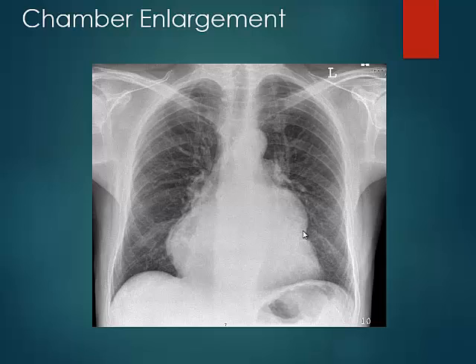Mitral stenosis. From which cause? Rheumatic. Okay, so it's specific to rheumatic valve disease of the mitral valve that we see enlargement of the left atrial appendage. Otherwise, because rheumatic valve disease is less common in the Western world, we don't see left atrial appendage enlargement like this. So this patient had mitral valve stenosis from rheumatic disease, had enlargement of the left atrial appendage, and subsequent pulmonary venous and pulmonary arterial hypertension, and also right atrial dilatation.